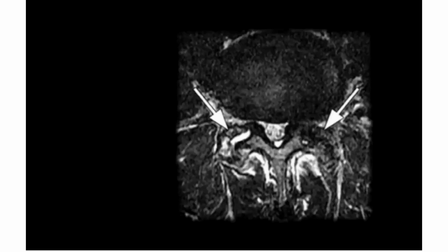Look at this MRI. Again, this is an actual patient. Look at this. What is there? Synovial cyst. Yes, right. It's fluid. Synovial cyst. Yes, synovial fluid inside the joint. It's not just forming a cyst, but it's a synovitis of the facet joint. Right? Compare with the other side.